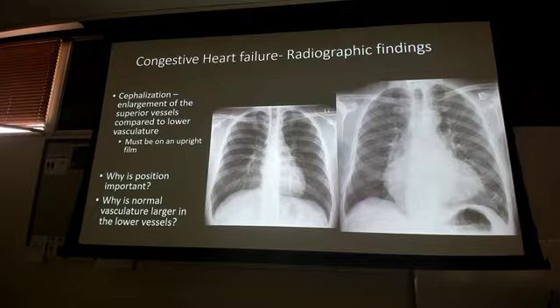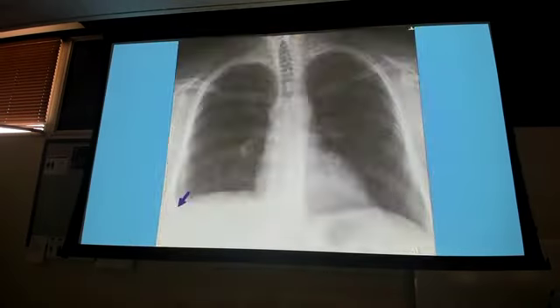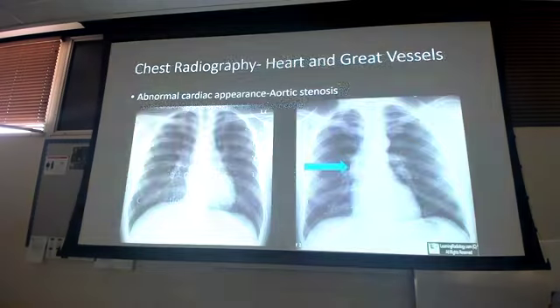What else? Sir? Some of your slides put the left lateral, sometimes the spine's on the left, sometimes the spine's on the right. Still left lateral. Still left lateral. Ideally, they should all end up being flipped. Let me find it. Yeah, Cardi B. Left laterals.